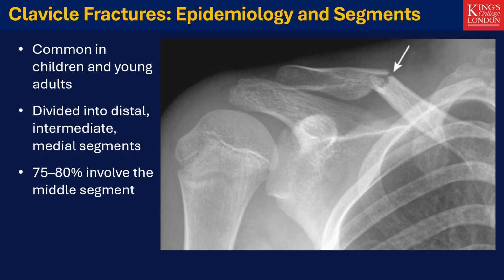Clavicular fractures are common. The clavicle is divided into distal 25 to 30%, intermediate 40 to 50%, and medial 25% segments. Most fractures involve the intermediate or central segment. Location and displacement determine stability and prognosis.